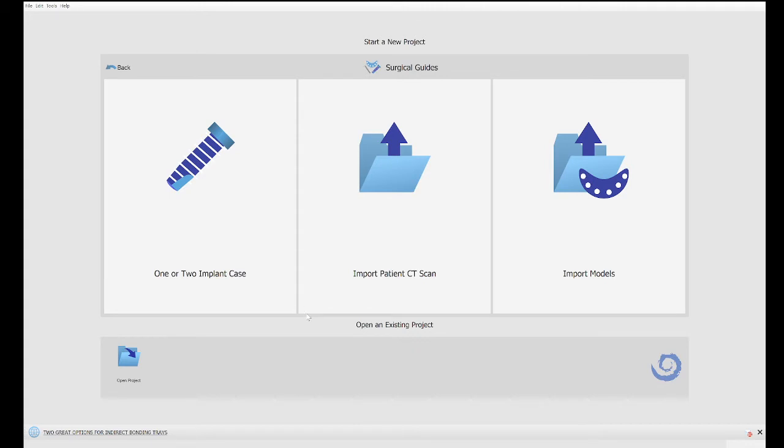If you see here, Garcia Elias, I'm going to keep hunting through different subfolders until I find the files. You see those files are going to be ending in DCM, that's DICOM. So you select that folder, or you can select Garcia in this case, and it'll find it itself. We're going to select Garcia only. I'm going to click OK, and the computer is going to locate the DICOM files.